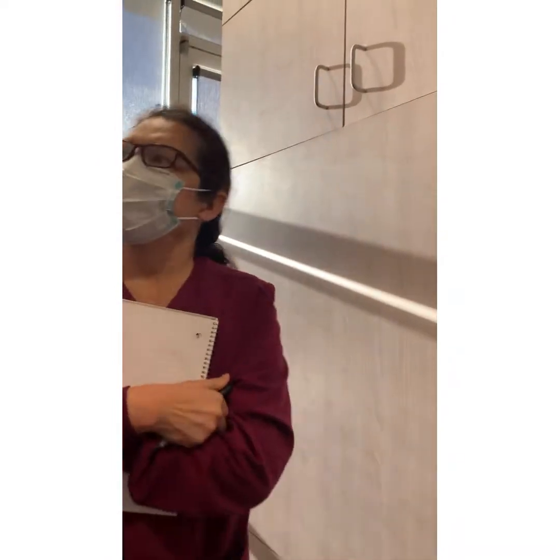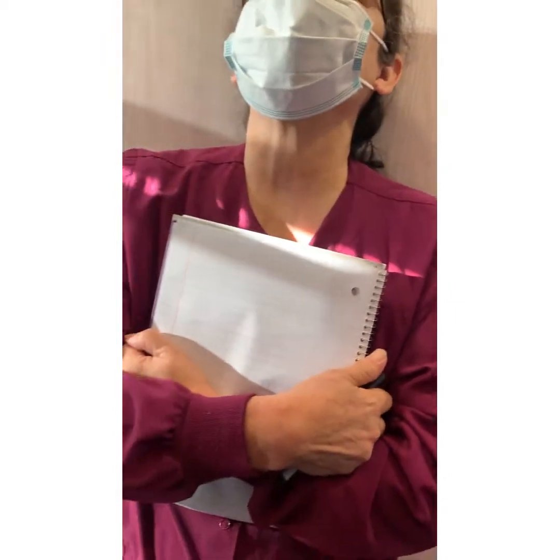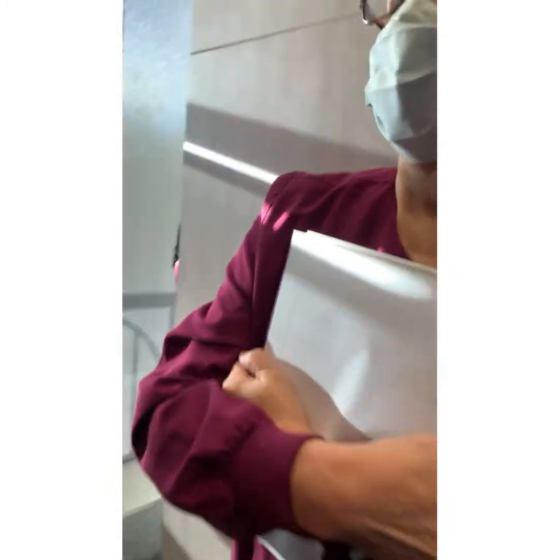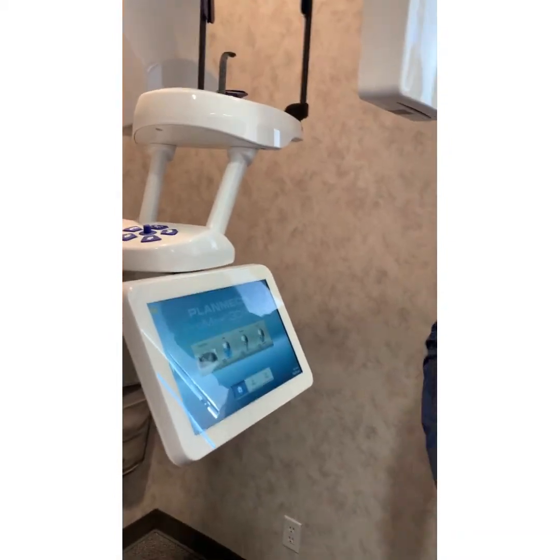I'll be quite honest with you, I've never run into larger noggins. I just have not run into that. And it'll be so few. This thing really only goes up for like a 6'3". Oh, really? Because we have some guys bigger. You're going to need a chair. And there's going to be people outside the 85% of the types that are going to require a little creativity. We have some who are 6'6", or a football player, and they can barely fit in.